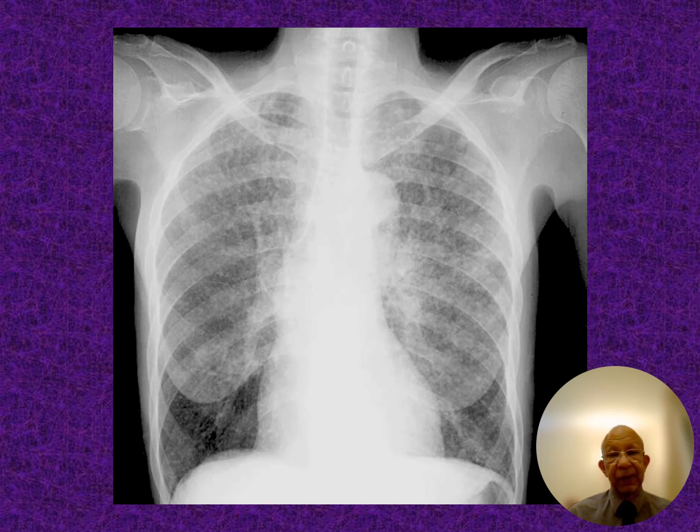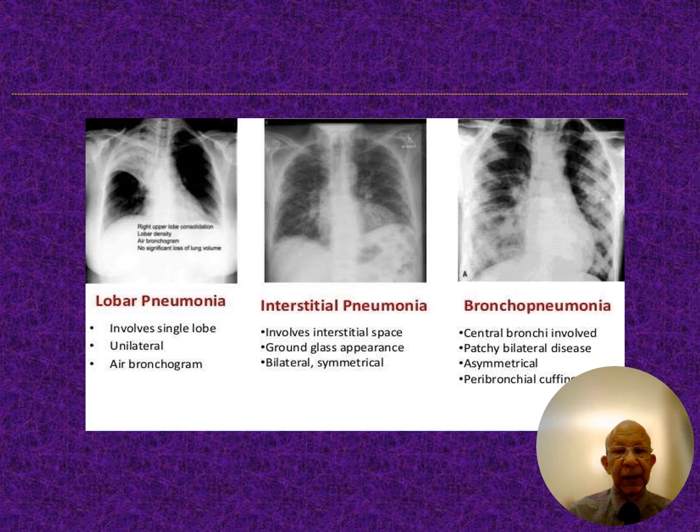And now you can see here, this is more of a nodular pattern. The small nodules, 2 millimeters, right? And this is typical, 2 millimeters or less, and these are typical of miliary TB, right? So this is a nodular pattern due to miliary TB, okay?